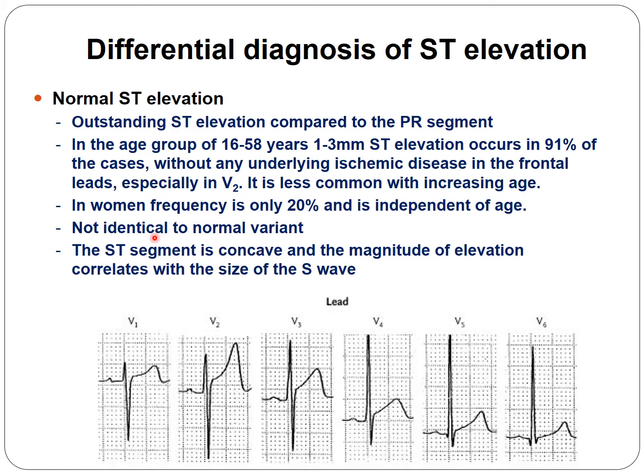Not identical to the normal variant. That's a different one we are going to discuss in the next session. The ST segment is concave, and the magnitude of the elevation correlates with the size of the S wave. As you see here, deep S, and when the S wave is deepening, the ST elevation increases.